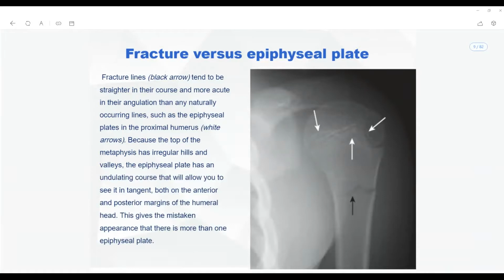You have to make sure which kind of joint you are looking at. Because I tell you, most doctors make this kind of mistake, holding the x-ray on the reverse side. If you hold it reversed, you completely mistake it as the opposite side of the body. So please make sure that you are looking at the labels that are present on the x-ray.